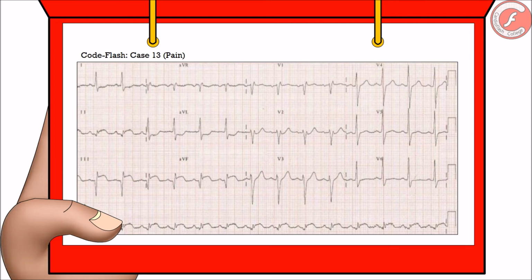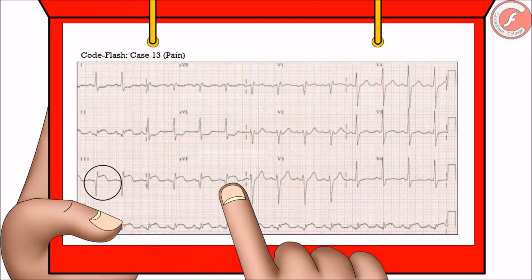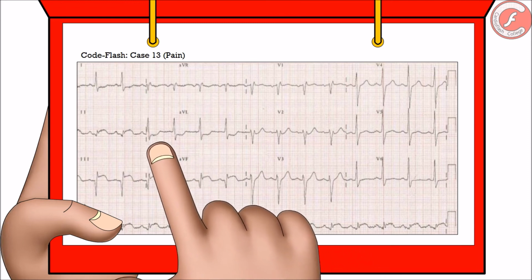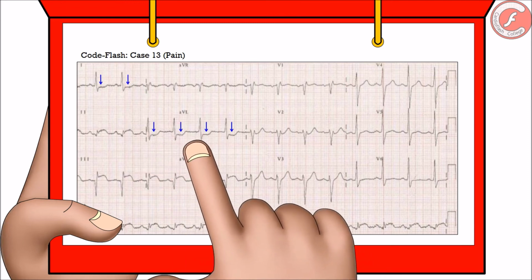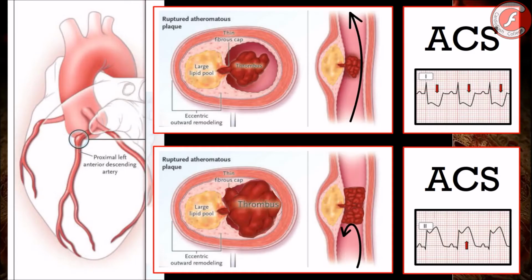That's it! In this electrocardiogram, we can see that there are Q waves and the elevation of the ST segment in the inferior leads, more evident in lead 3 regarding lead 2. Moreover, it is relevant to point out that there is a mirror image descent in lateral leads 1 and AVL. But what clinical relevance does this have?